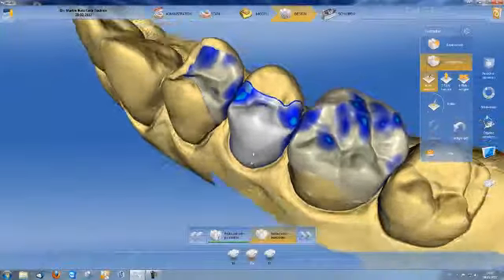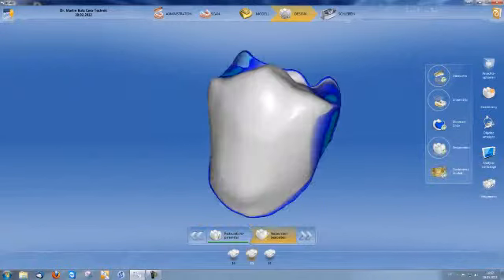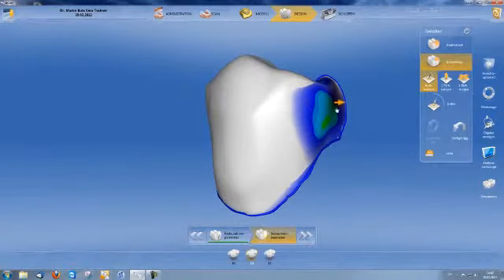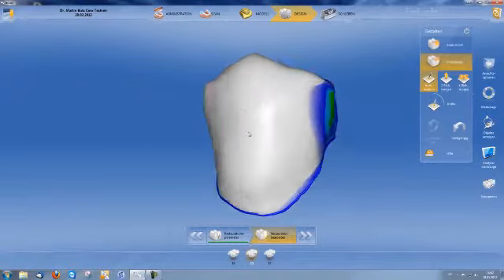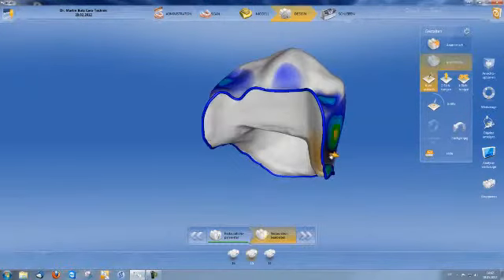In the next step, I check my proximal surfaces. For this, I click on Trim Model and again see very thin proximal surfaces. We increase the size of these a little. We do the same on the mesial side, making them thicker, and then we adjust minimally.